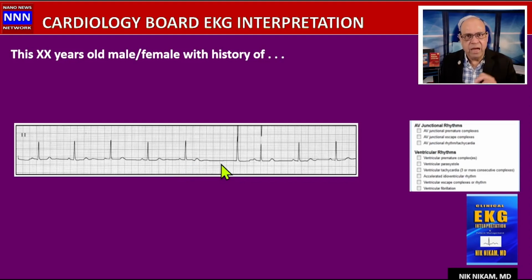That's the next question. This is beyond the scope of this particular examination, but just for understanding purposes, I'm going to tell you here, because this could be a precursor of what might transpire in the coming days or hours. If you look at the PR segments and the ST segments and T wave changes, this T wave looks different from these T waves. What does that mean? Is there a blocked PAC causing a pause, and then we have an escape junctional rhythm?